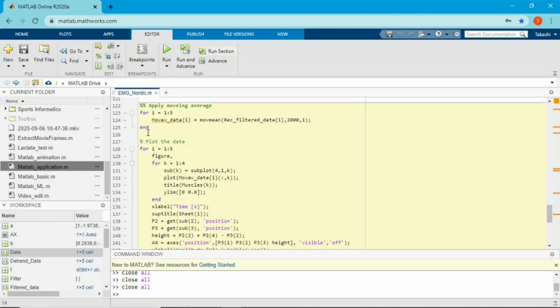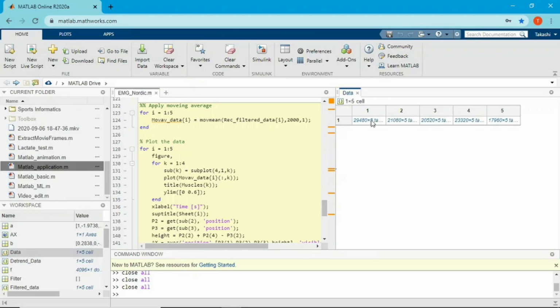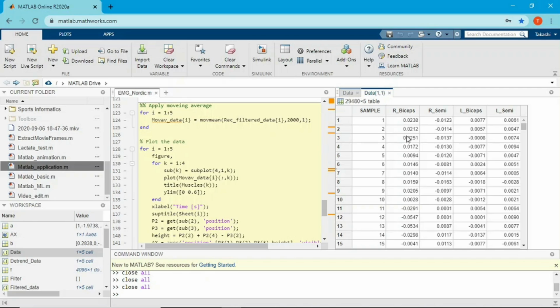Then I move one number to the right, and I'm gonna do the same thing, find the average of 10 sequence. So the first 9 are 1, but the moving average introduces one extra number, which is the 11th data. You know what? I'm gonna show you the data, and I will show you what I mean. So first 10 data, and I'm gonna find the average and put the average data in the first position, like let's say right here. Then I'm gonna do another moving average. So the next 10 sequence from here, like 2 to 11. Then I'm gonna find the average and put the data right here, and move one data point right here, and do the average of the next 10 sequence, and put the average data right here, and do the same thing until the end.